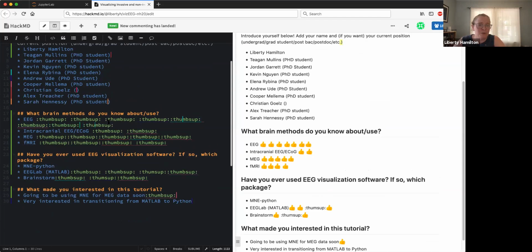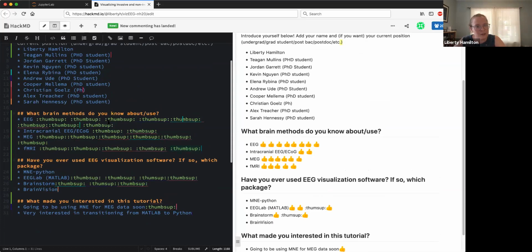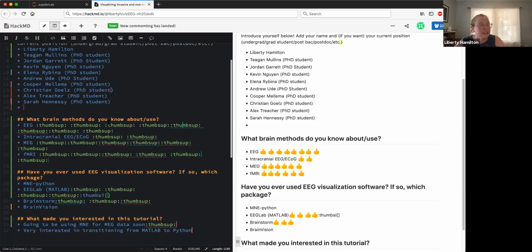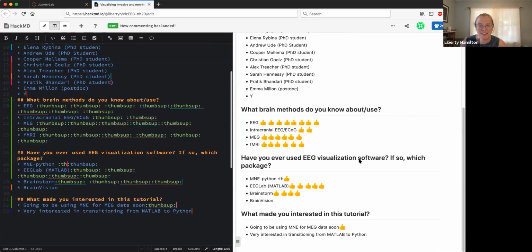And here, actually, as I said before, MNE-Python was, I believe, originally developed for MEG and then EEG. And now there have been more and more contributors who are working with intracranial data, which has its own set of difficulties because a lot of it is not particularly standardized. And so if you went to any of BIDS tutorials, you'll see there have been efforts to try and standardize things a little to avoid this. But all right, so I'll just give a little bit of time.